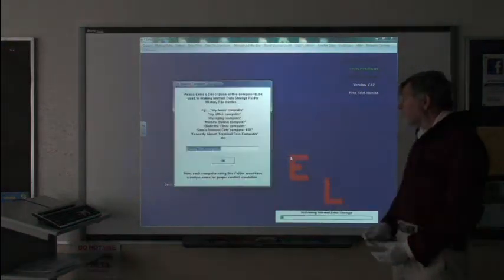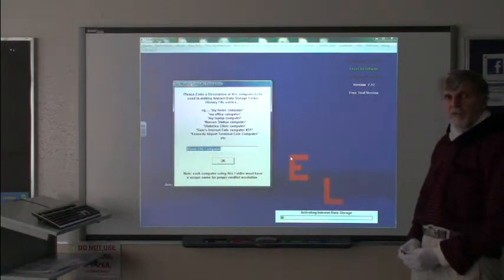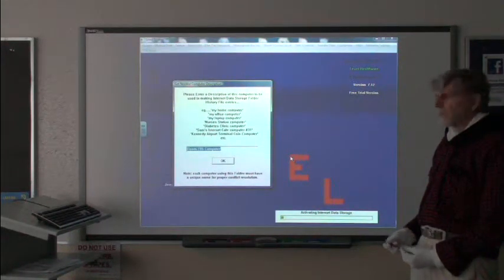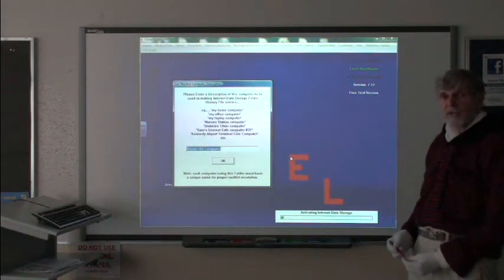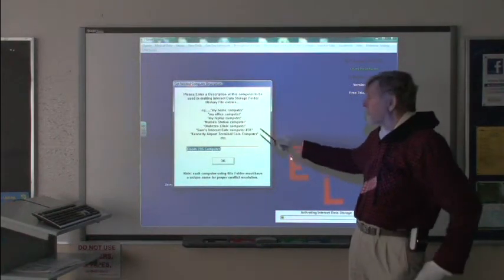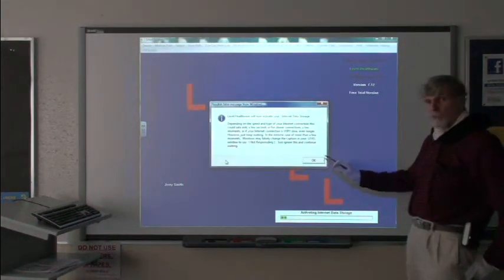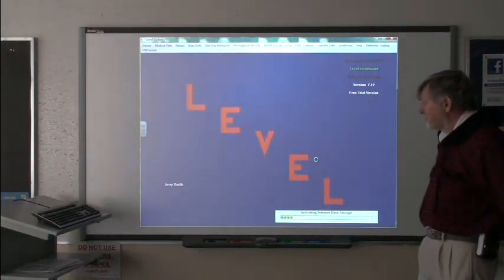So now we want to create this folder with this password, and as usual, for entries into the history file of all activity on this Internet Data Storage location, you assign a name to each computer of your own choosing. A suggested name for this computer would be Room 205 computer, since that's the room that we're in. Other suggested names for some of your other computers might be my home computer, my office computer, my laptop computer. So the name has been assigned, and Level Healthware will now activate the connection to this Internet Data Storage.